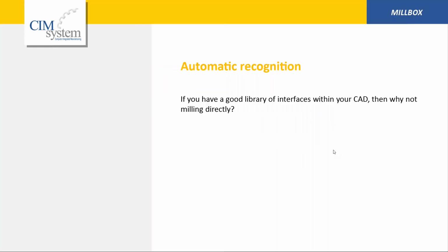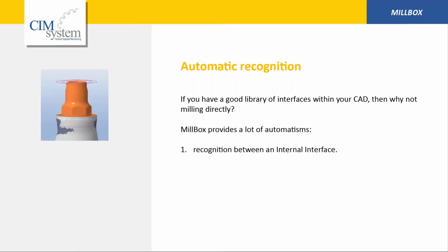It's important that inside automatic recognition, we can manage the STL file directly if it has good surfaces, also because MillBox provides a lot of automatism. For example, it recognizes an automatic internal interface, like this example we're seeing in the left part of the monitor.